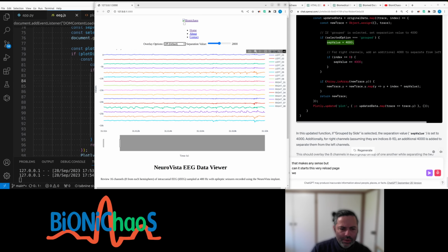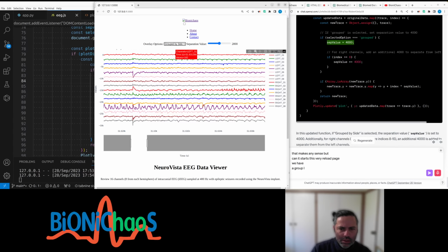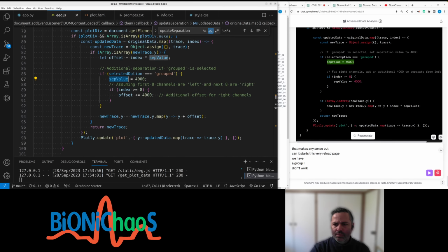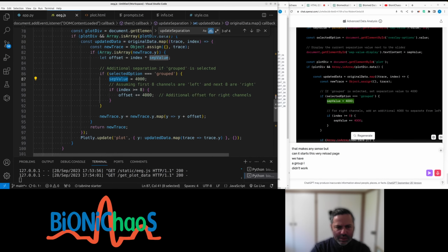We have a group by side. Didn't work. No change in there.